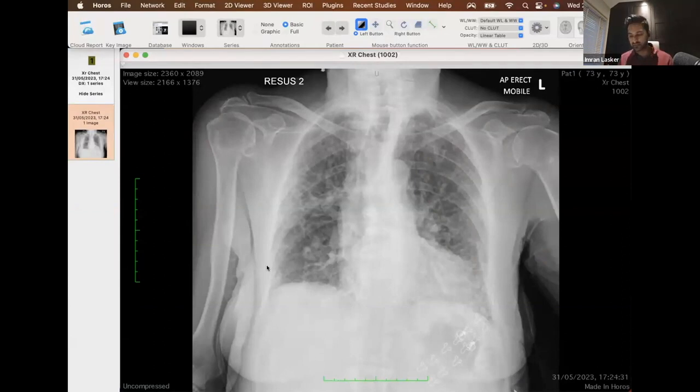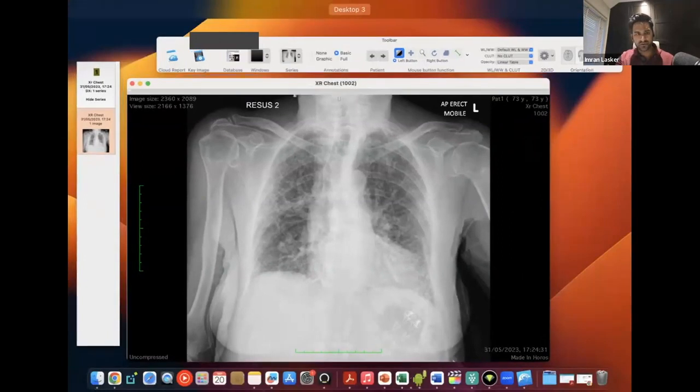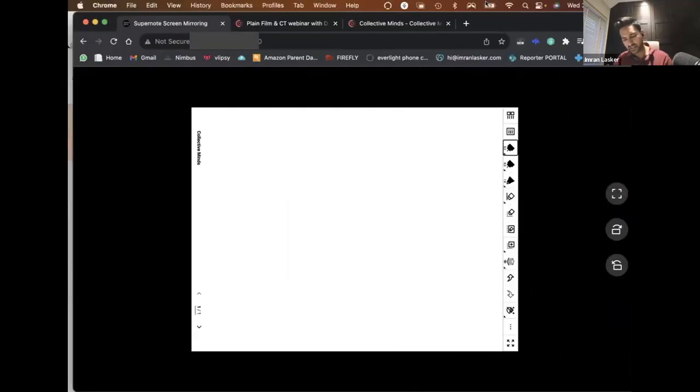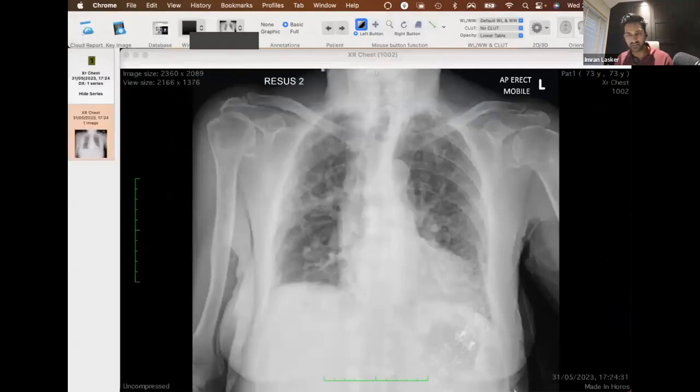For those that don't know this, there was an acronym, wasn't it? The acronym was LOSS, right? So it was loss of joint space, osteophytosis, subarticular sclerosis, and subarticular cystic change, something like that. So that would be osteoarthritis. And that's actually what we saw with the patient's shoulders rather than anything else. So I don't think we could go for rheumatoid arthritis per se on that.